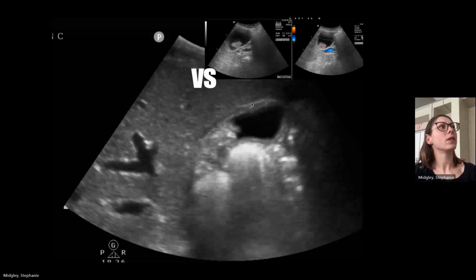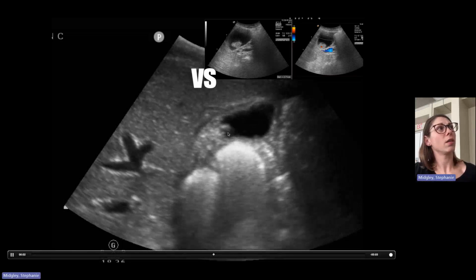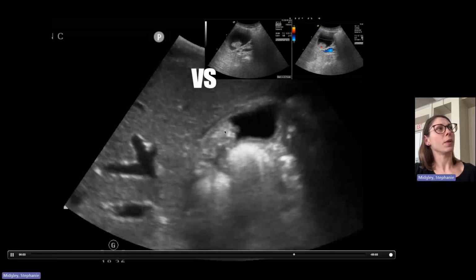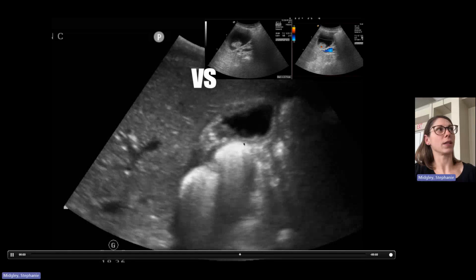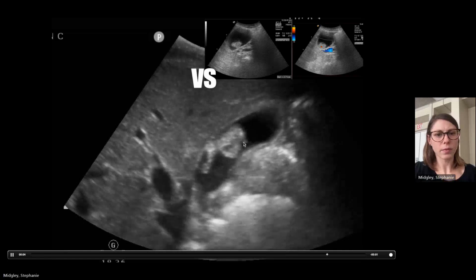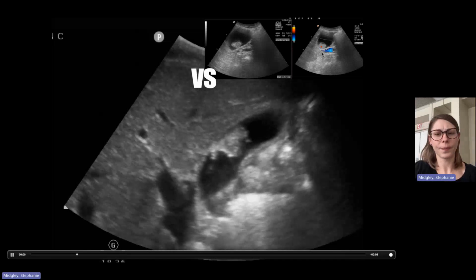So sometimes sludge balls can take on this weird dense polypoid looking thing and be mistaken for malignancy and polyps. So this was a tumefactive sludge ball on a patient that actually came in as a trauma. We were just scanning them for practice. And I was like, I think you need an official ultrasound. That doesn't look normal. And it just came back as a sludge ball. So again, a way to figure out if this is a tumor versus a sludge ball is color flow.